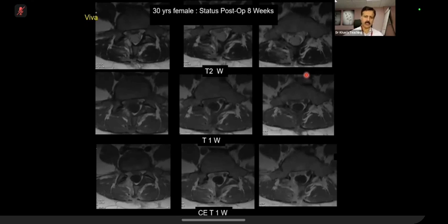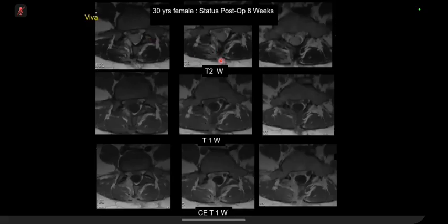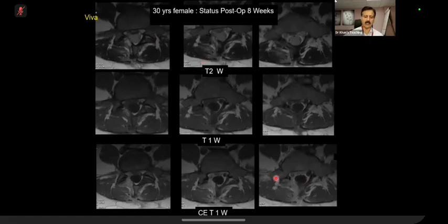So this patient is post-op and there is a laminectomy on the right side, and the patient has got recurrent pains, etc. They have asked for imaging again. So we have done a T2 weighted sequence. And then we have done here, this line here is contrast enhanced T1. This line is T1 without contrast. Over to you. What is the important point? How will you report this case?